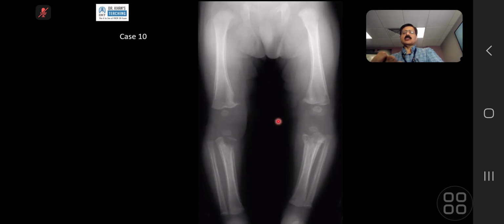Also, whatever differential is relevant in this age group, mention that other than these erosions, the rest of the bones appear normal in density. There is no evidence of Wimberger sign as far as the epiphyses are concerned. There is no Pelkan spur. There is no metaphyseal cupping.